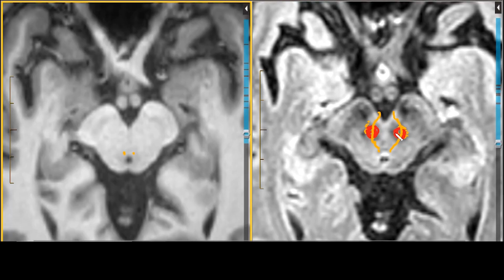Now, a couple of other salient points. When the third nerve comes out, as it exits in the interpeduncular cistern, it's mesial or medial to the substantia nigra. So it's not going to come out over here. It may look like it does due to volume averaging, but it's going to come out always medial to the substantia nigra. So that's another trick for locating its apparent exit from the midbrain. In the next vignette, I want to talk a little bit about what can happen to the third nerve and various syndromes in the intramedullary space of the midbrain, like Weber syndrome. Let's move on, shall we?